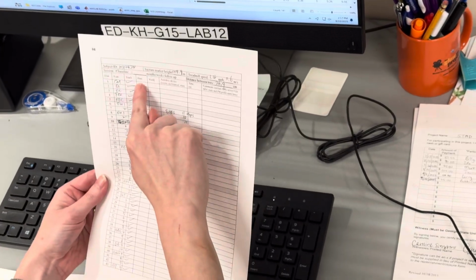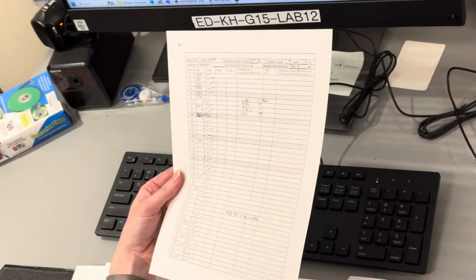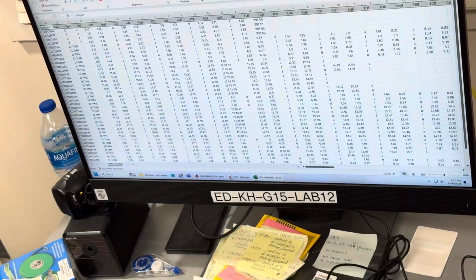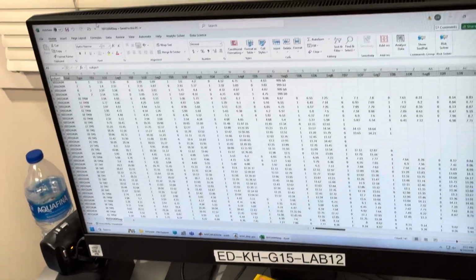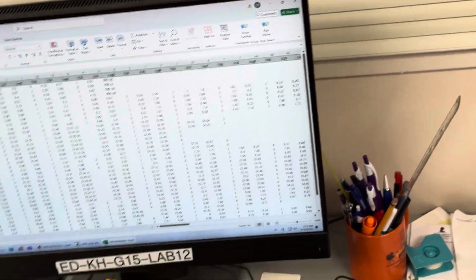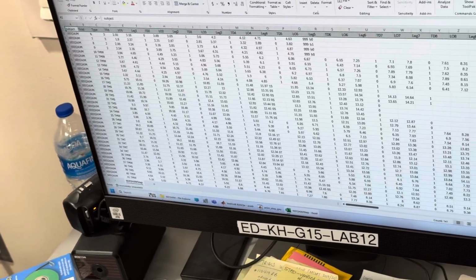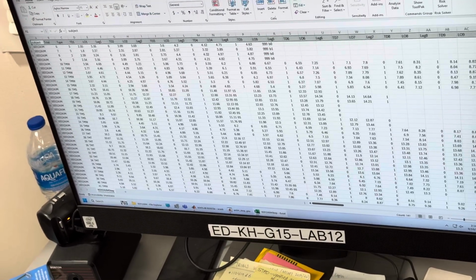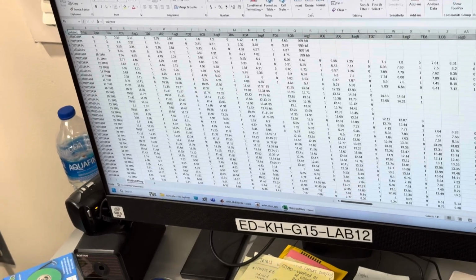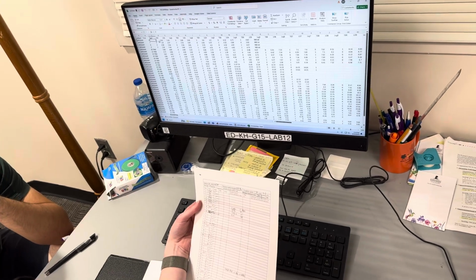So these first ones, as you probably have seen, are the calibration and then the standing balance trials. For standing balance, you don't have to do this, because there are no steps. As you can see, this starts at number 6 here. 5 were standing balance. It depends on the project. For this one, yes. Sometimes there are some, like I know Sarah has a bunch of different balance ones, but this is our standard setup. Okay. And then you can see this is fast walking 1 and 2. So the code for fast walking in this is going to be 3.